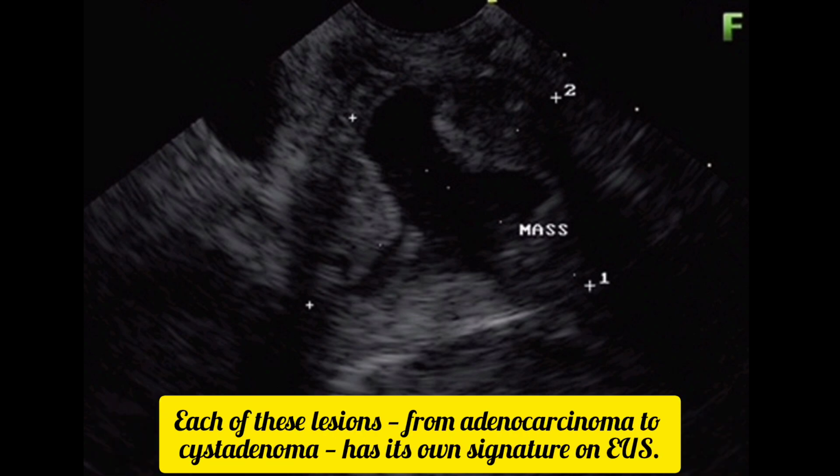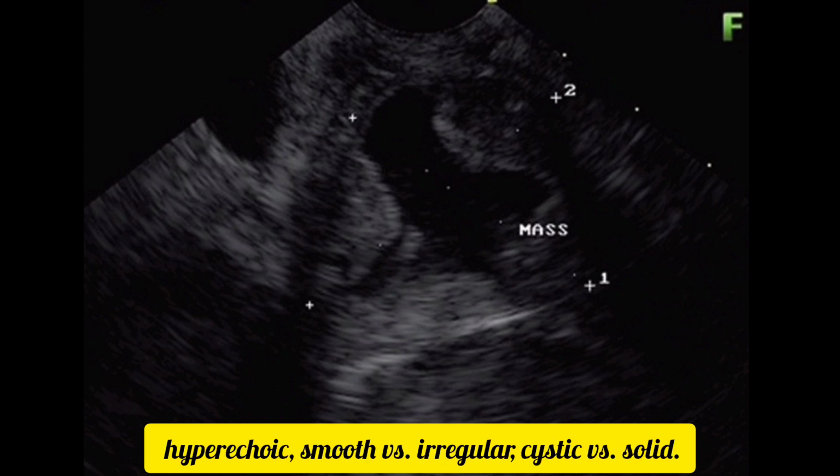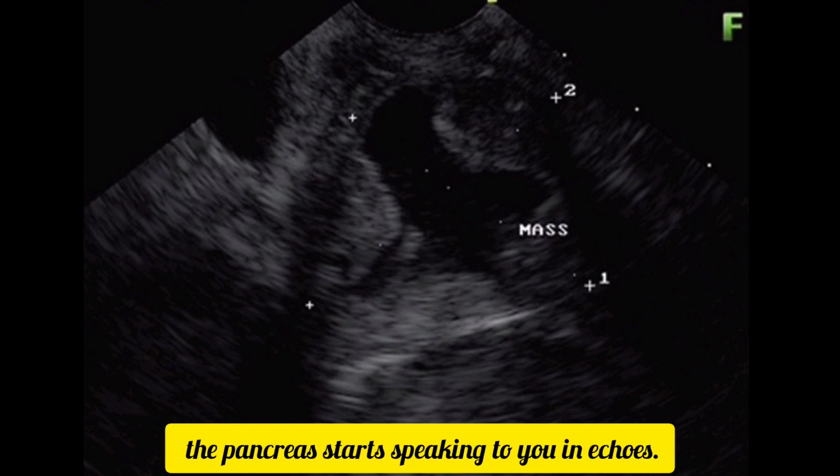Each of these lesions, from adenocarcinoma to cystadenoma, has its own signature on EUS. The key is pattern recognition: hypoechoic versus hyperechoic, smooth versus irregular, cystic versus solid. And once you can read those signatures, the pancreas starts speaking to you in echoes.